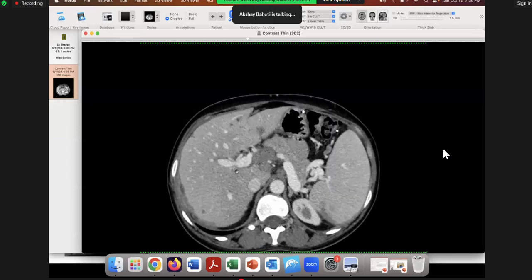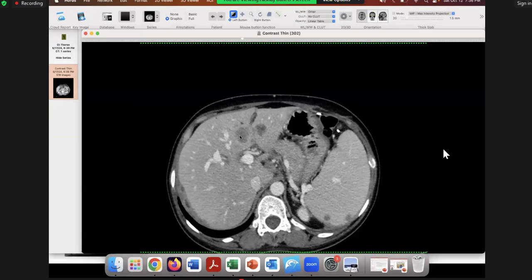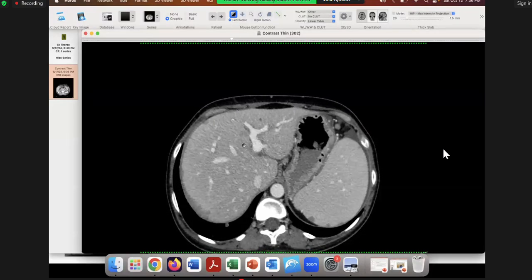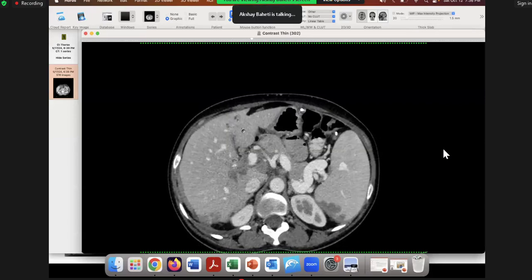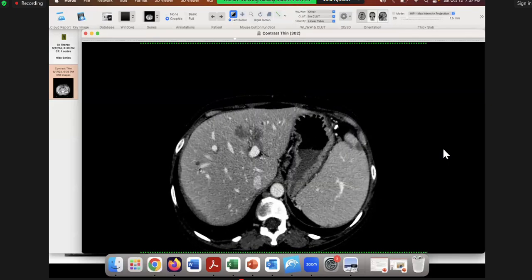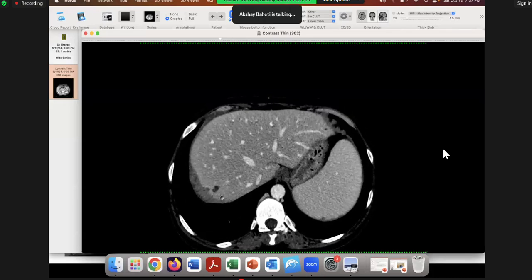What about this though? What is happening here? And what is happening here? What is this? What do you think? These are deposits. Intrahepatic or surface? Intrahepatic. Okay. So this is the teaching point for this case. Again, you see something here, but I'm not sure this is really disease. This one I think could be cyst also. And this one again, I'm not sure. Maybe that's deposit, maybe that's cyst.